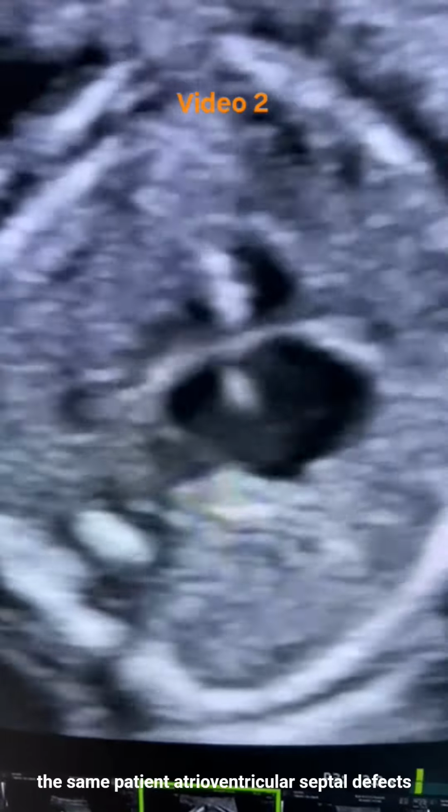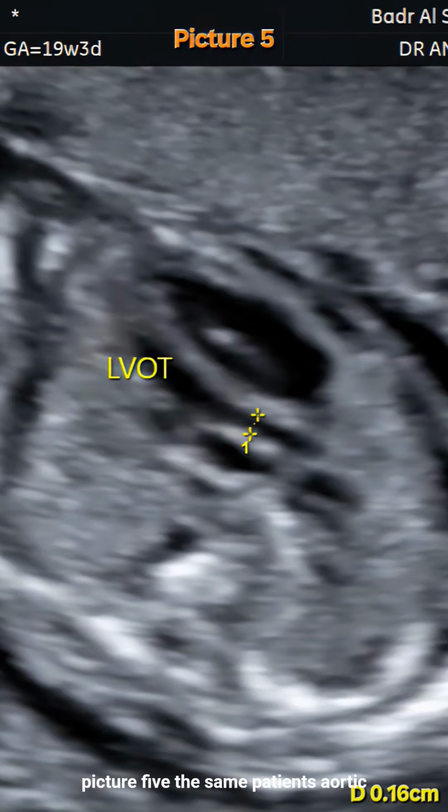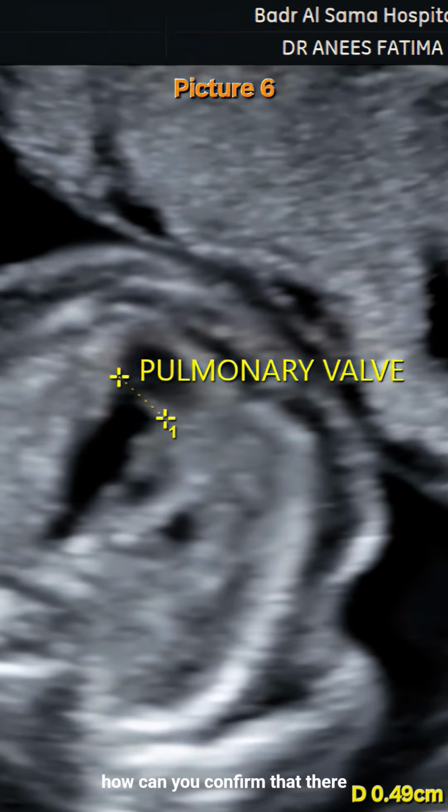Atrioventricular septal defects can be balanced and unbalanced. In picture 5, the same patient's aortic valve was narrow and measured only 1.6 mm, whereas normally at 19 weeks gestation, the aortic valve should measure about 3 mm. Now, how can you confirm that there is aortic stenosis?